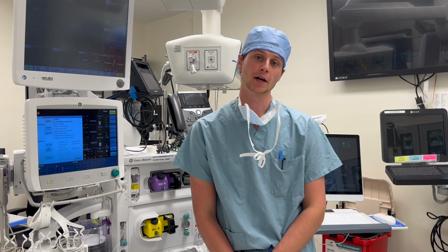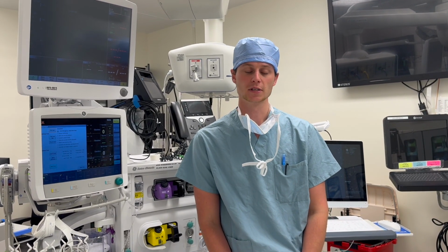So this is a quick overview of an ENT OR setup. Make sure you go through your MS MAIDS as usual. If they're doing any sort of nerve monitoring, make sure you have remifentanil ready to infuse into the patient. And make sure you have open discussion with your attending and the ENT surgeon about the airways you're going to use. This also needs to move forward into the case, as a lot of the times, as I said, the surgical team will be messing with or adjusting the airway.